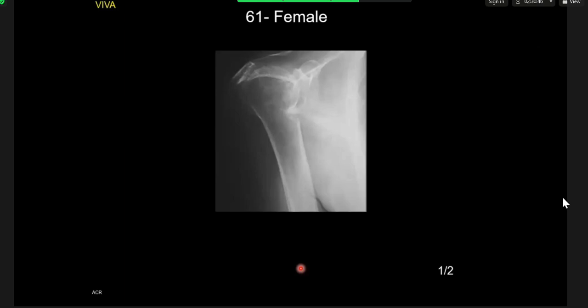Right? Can I ask you a question? Where is the clavicle? Do you see the clavicle? No, I can't see the clavicle. Right. So can you make up your final conclusion then? Maybe it's traumatic, like a sequel of old trauma. Or maybe it's some sort of syndrome, and this is like the sequel of syndrome at the age of 61. Not really sure. That's fine, I'll take over.